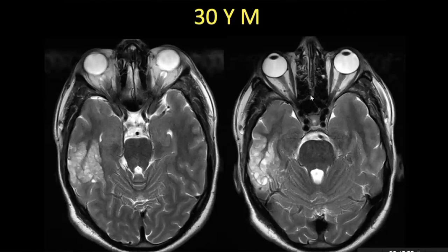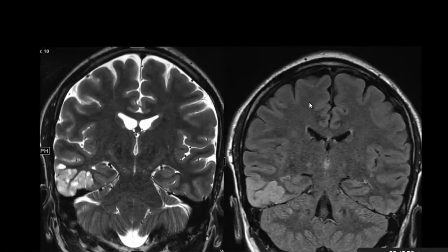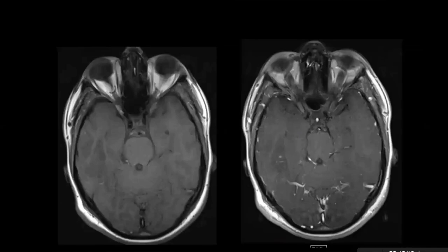So based on these, and these are coronal slices, T2 weighted images and FLAIR. Again, I can see there is a lesion in the right temporal lobe with a bubbly appearance, and it is cortically based. T1 pre and post. The T1 and post contrast show the lesion is isointense on T1 and does not show any post contrast enhancement. Just a little bit of a dot here.